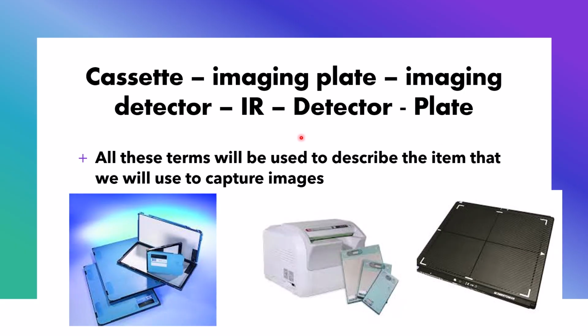So if we look at this example of them, this is the old screens, the old X-ray cassettes that had an intensifying screen and a film inside of it. This is the CR setup. We actually have a CR reader in the lab. If you look around, you can find it. It's where we put the plates in here, and then the image appeared on the screen.